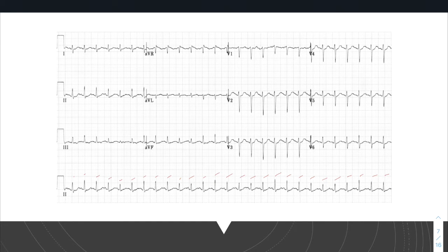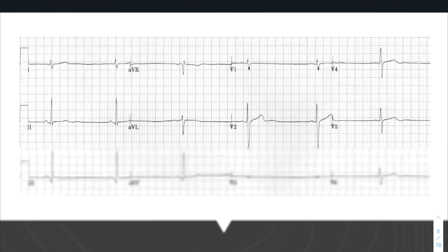And if we're going to use the 10-second method to determine the rate here, we had 27 peaks like we said. You want to multiply that by 6. And that's going to give you a rate of 162 beats per minute. And that's a pretty good indicator. Again, this 162 BPM is indicative of a tachycardia, and the rhythm is normal, so this is sinus tachycardia.